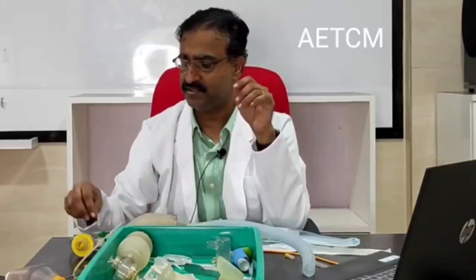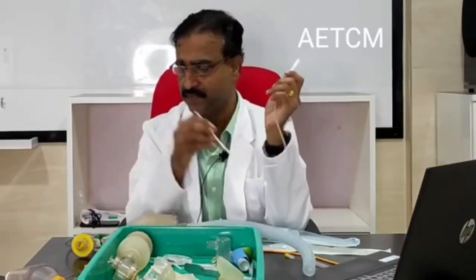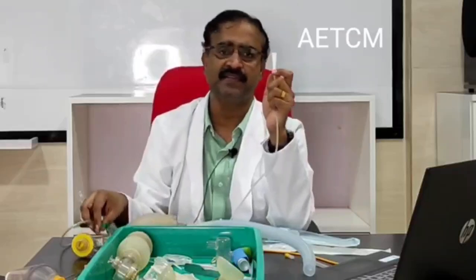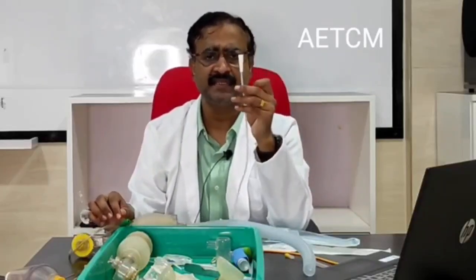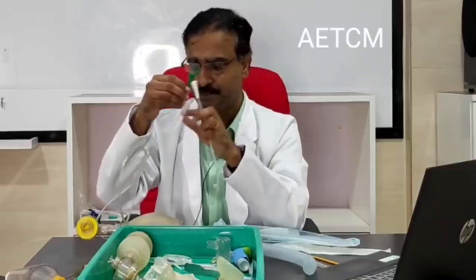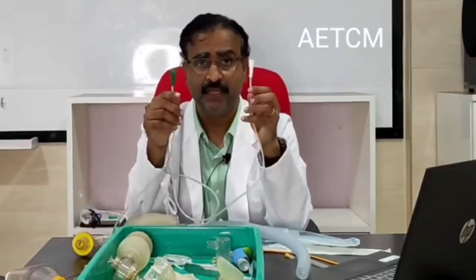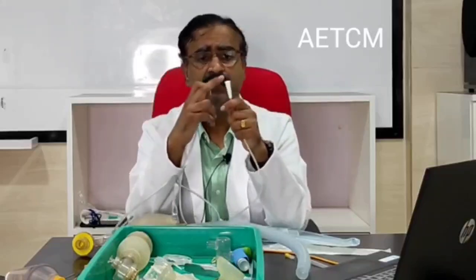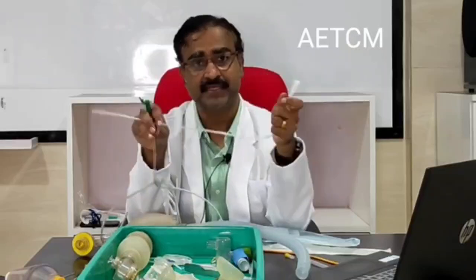Let's go to the next instrument. The next instrument is something which you can actually get confused very easily, and that is the suction catheter. Okay. Now there is a marked difference. I am going to use both to compare. A difference in this catheter from the prior catheter that I showed you. Now in the prior catheter that I showed you, which is the nasogastric tube, you find a cap. A big difference. Here there is no cap because this is a one-time catheter. You just do a suction and you discard it.